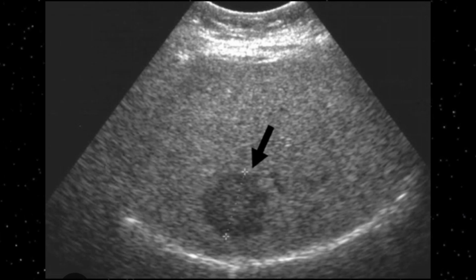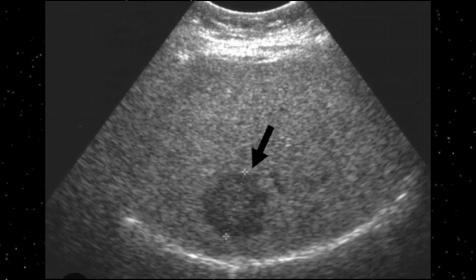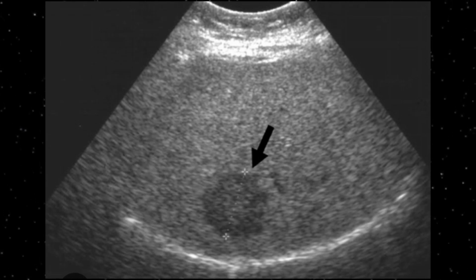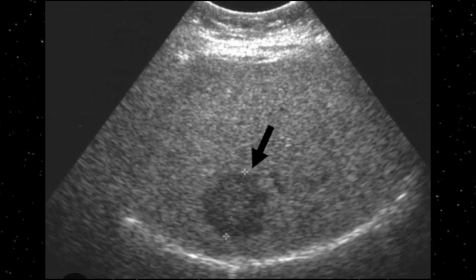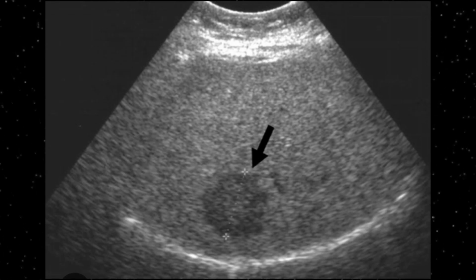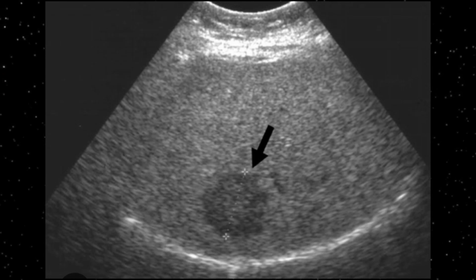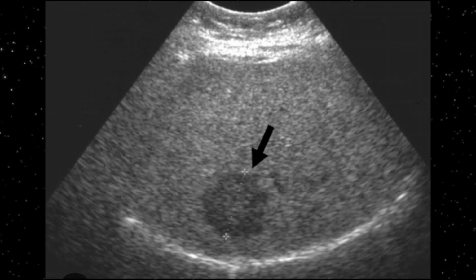However, there is a difference in echogenicity. So this is focal nodular hyperplasia. If you concentrate, the margins of the lesion are smooth and rounded. There is no interruption. This is a space occupying lesion and this is focal nodular hyperplasia. There is no central cystic degenerative change. There is no calcification in it. So this is focal nodular hyperplasia in the right lobe of the liver. So compare with other clinical information and the patient history as well.